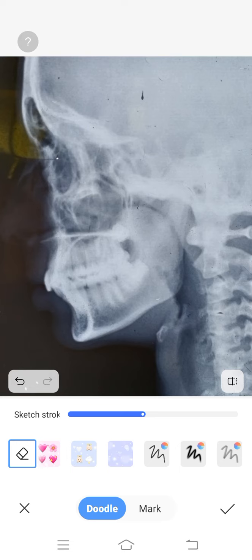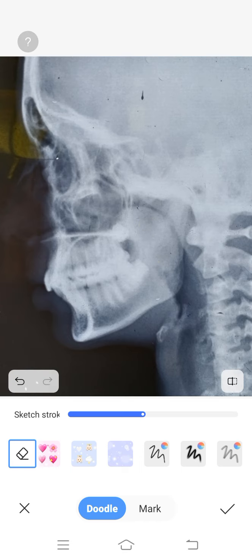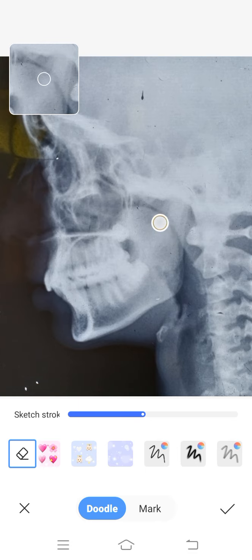Since the direction of the maxillary sinus opening is posteriorly, this grows posteriorly and then prolapses into the nasopharynx, and if it is sufficiently large, it hangs behind the soft palate into the oropharynx region.